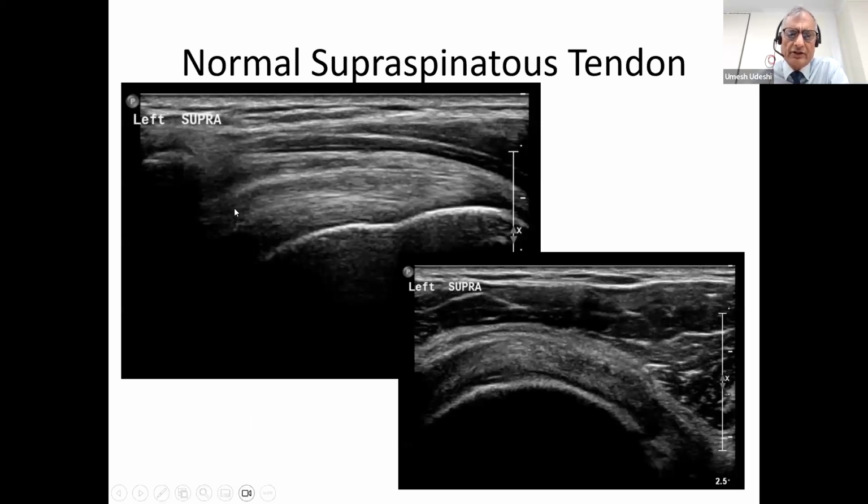So this is showing the supraspinatus tendon here, this sort of slightly gray stripy structure. And this is the greater humeral tuberosity with a tendon inserting there. This is a sagittal image or a transverse image to this one. Here's the tendon again. From here to here, there's a slightly separate structure here. That's the long head of biceps tendon. This little dark line above, that's the tiny sliver of fluid in the subacromial bursa. And this is muscle and soft tissues, fat underneath the skin.